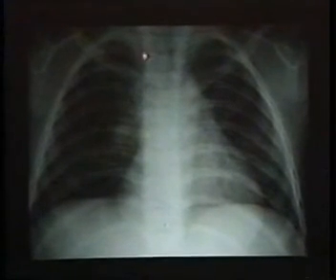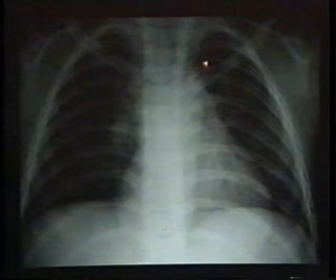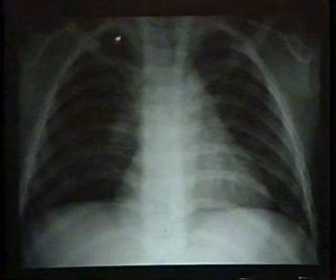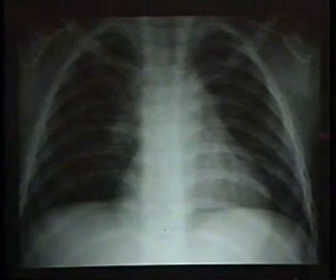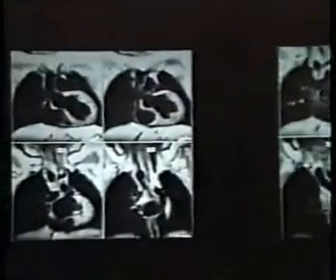Another patient with tracheal displacement to the left, but notice the left descending aorta. There must be a right aortic arch and a left descending aorta. You can get some impression that the trachea may be displaced anteriorly. The esophagram illustrates the retroesophageal component as the arch passes from cephalad right to caudad left, producing a retroesophageal impression.